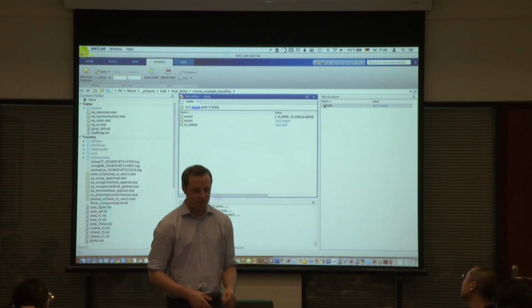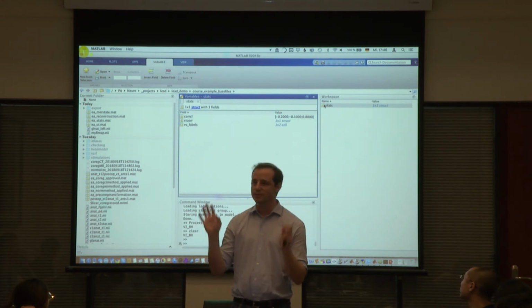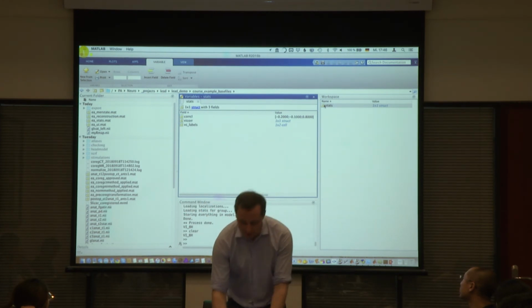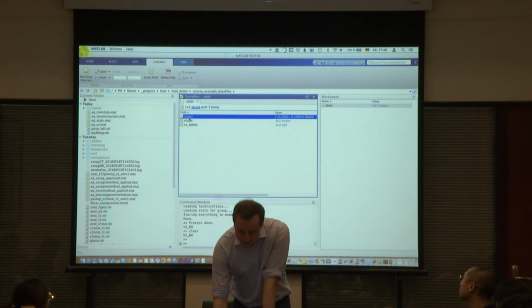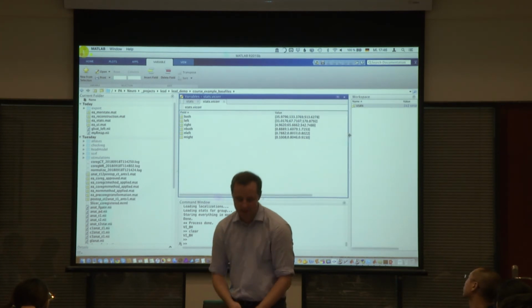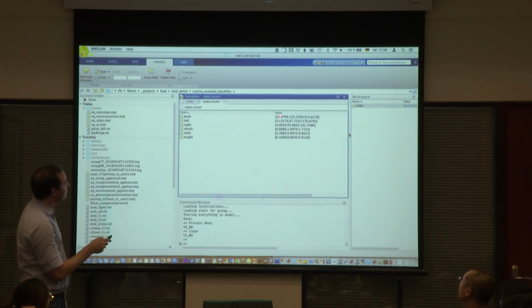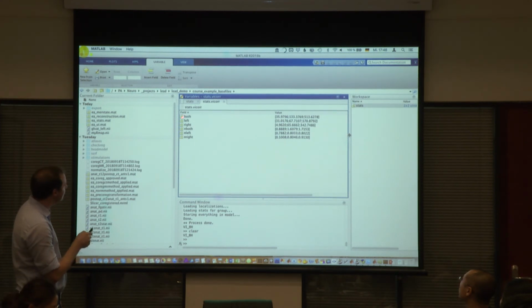So, you of course can also extract it from Lead Group, but even more important, you can use your own plotting tool or whatever to do this. And what we have inside stats is the core clinical, which is just the values we entered before, but then we also have the volume intersection correlations, and we have values that are the VTA intersections for the 3 subjects in cubic millimeters for both sides, left and right.